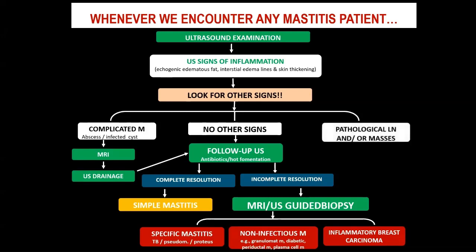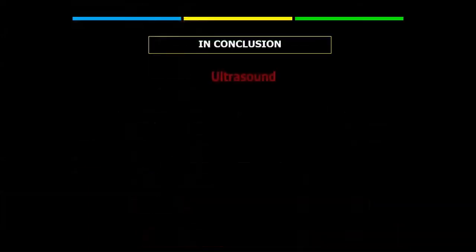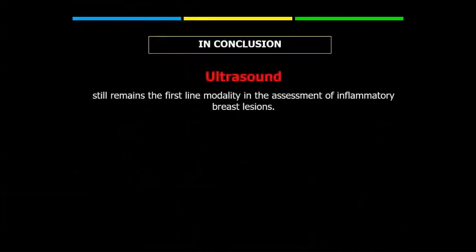While if from the start we find pathological lymph nodes or mass lesions within the breast, we should proceed directly to contrast imaging and ultrasound-guided biopsy. So in conclusion, ultrasound still remains the first-line modality in the assessment of inflammatory breast lesions.